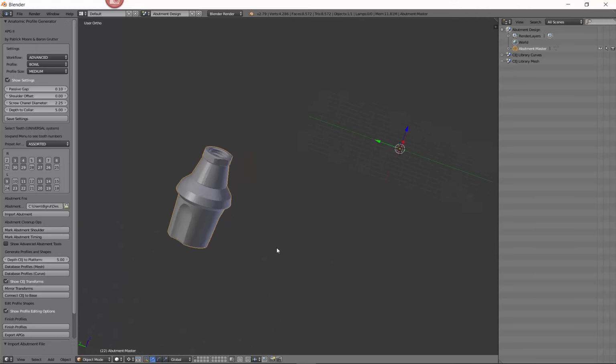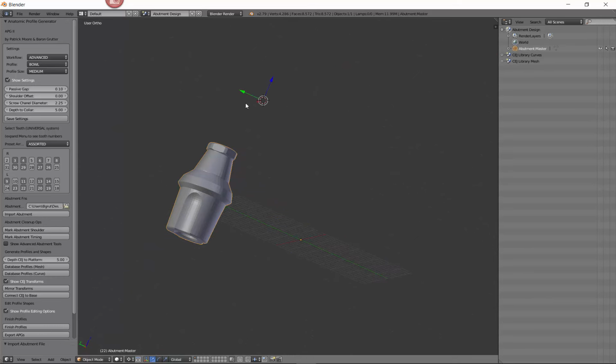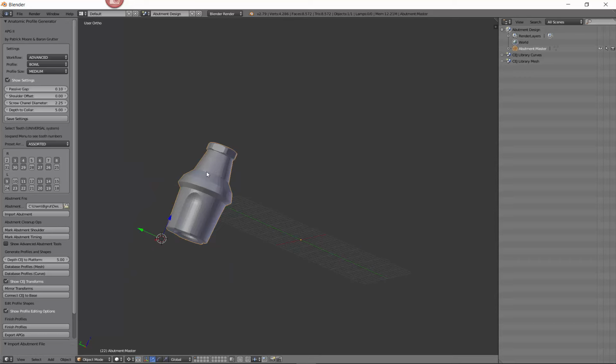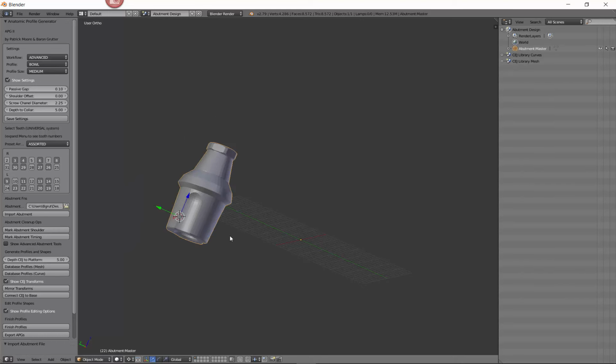Now if you're wondering, how is he moving this all around? I don't know. I'm pushing buttons and all I'm doing is clicking things around, or I'm grabbing and moving things. Your left clicker indicates areas of importance, okay? That's why the little thing gets moved around. If I right click, it allows me to grab something and move it. If you do that, hit escape, it'll go back to where it was.